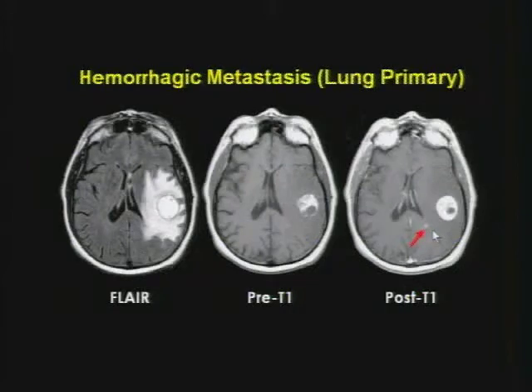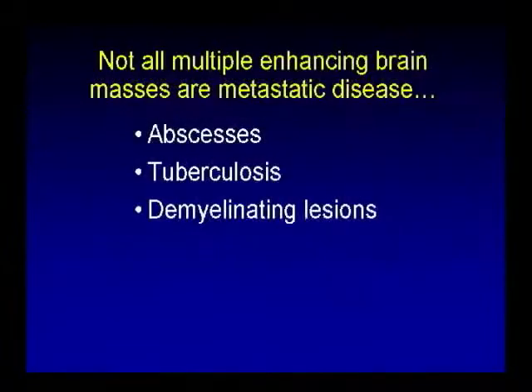And keep looking. We've now discovered several cases where we're so focused on the primary lesion, sometimes the second lesion can be easy to miss because you're so overwhelmed by, oh, look at that big Goomba, and then you're not carefully looking at other things.